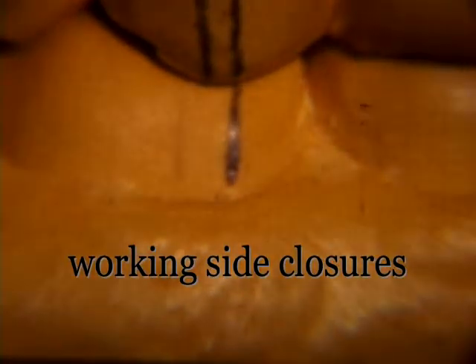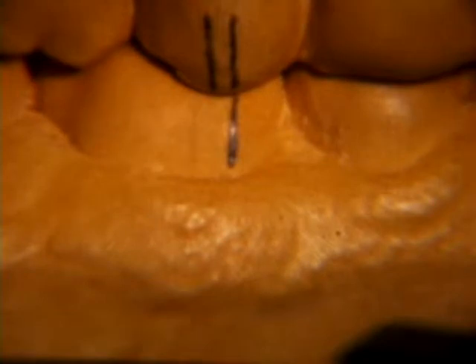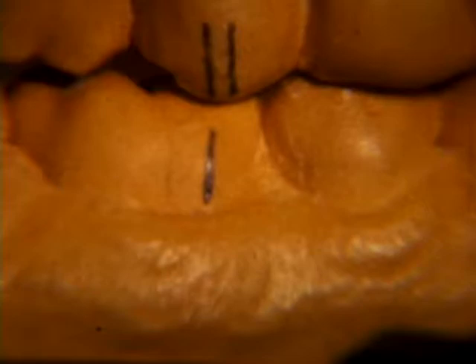In this next subject, the opening part of the chewing cycle has been deleted to better focus on the nature of the final closing strokes. The two pencil lines are made by first drawing a vertical line on both upper and lower teeth with the cast in the intercuspal position, and then stopping the replicator at the most posterior point of the working side closure to mark the retruded line on the upper tooth.